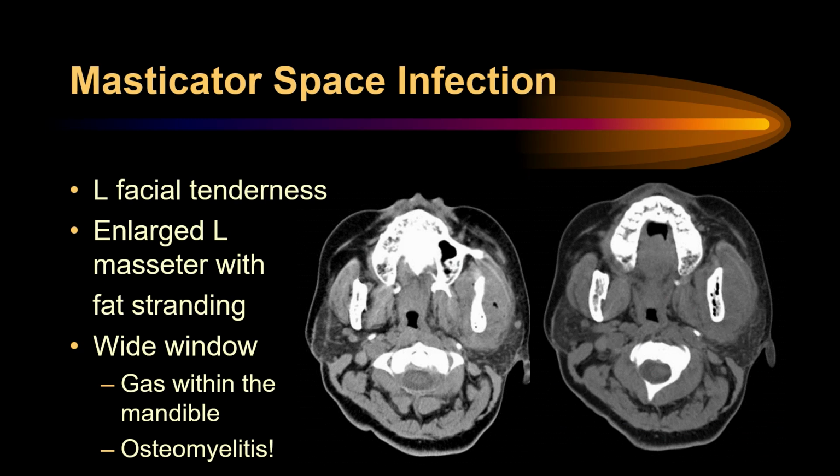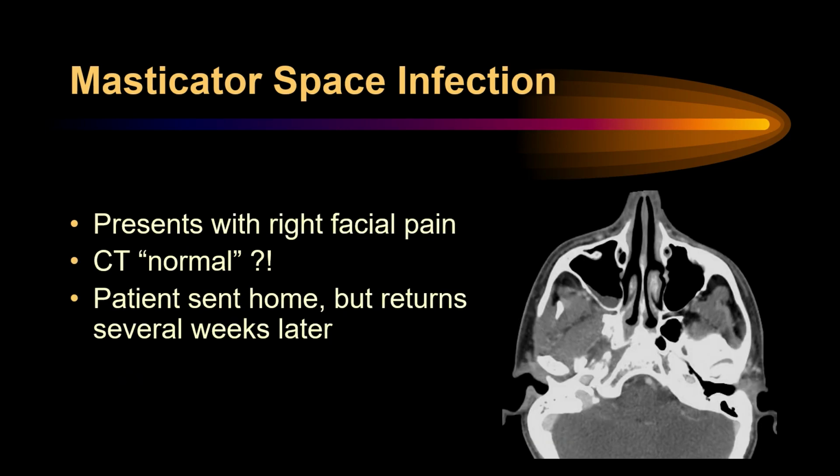How about this case? All right, patient's got some left-sided tenderness. We look over on the left. Yep, pretty big involvement of the masticator space. But what I did was I played with the windows a little bit.